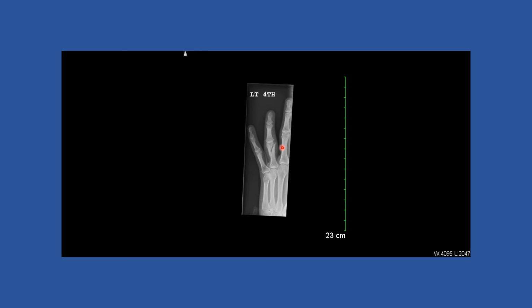Well, you do care if it involves the intra-articular surface and it's a joint that you really do count on to have some motion in it as far as function. Just because if it involves the intra-articular surface and then it heals in a way that decreases the function, that can be a dramatically impairing injury.